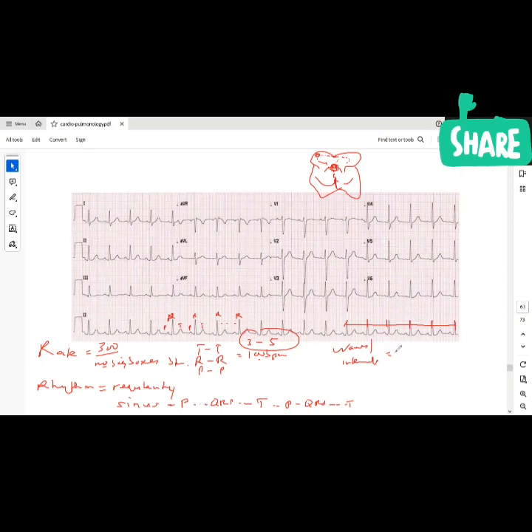So is the P wave normal? Typically the P wave is usually what it should be. With practice, you're going to get it. The P wave should be normal. It should not be as tall, right? And this is what I usually do. I usually look at the P wave compared to the T wave. You can see the P wave in terms of the height, right? It's not as tall as T waves normally.